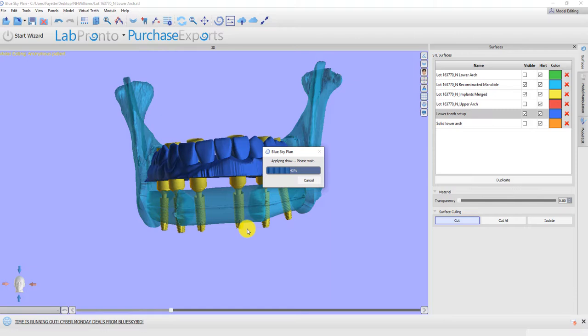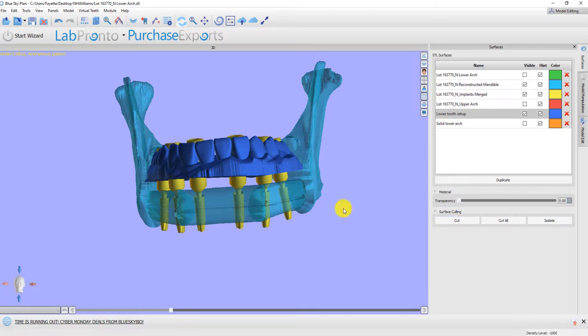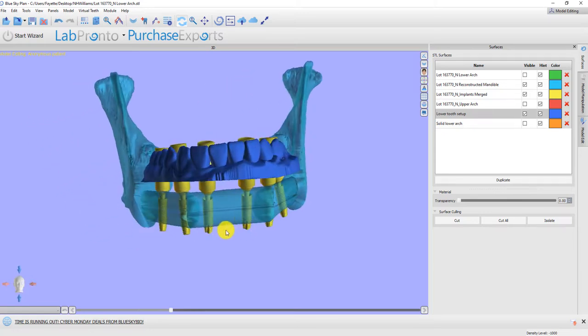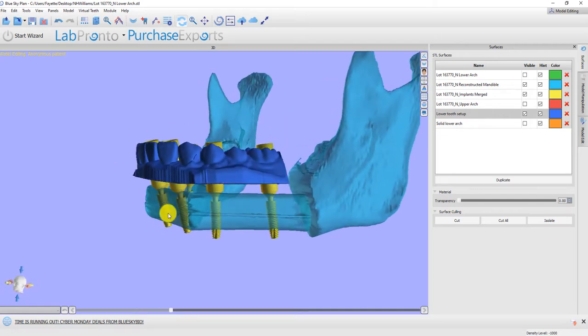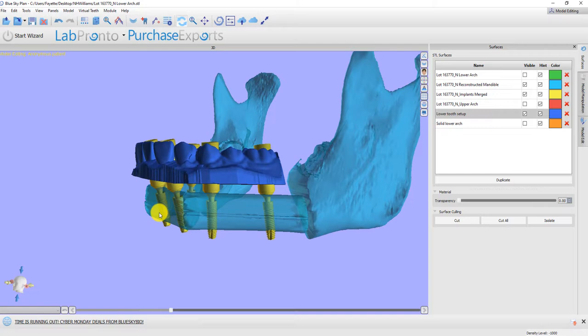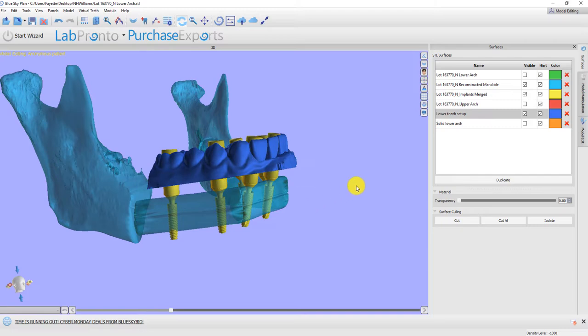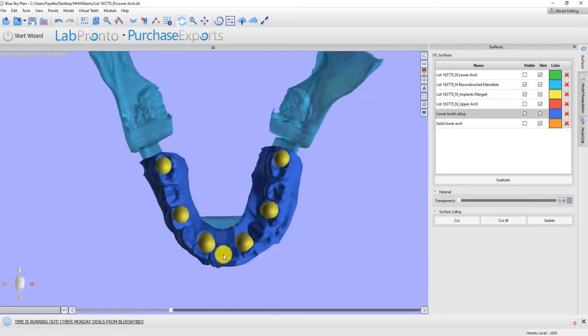And the trumpet-shaped portion of the abutments here is 3.5 millimeters tall, which is the height of the straight multi-unit abutment that I most commonly use. So the bottom of the cylinder is going to be where the temporary coping attaches onto the multi-unit abutment. So you'd like to have a little space for those to protrude down and not be really buried inside the prosthesis. So this looks pretty good there, I think.